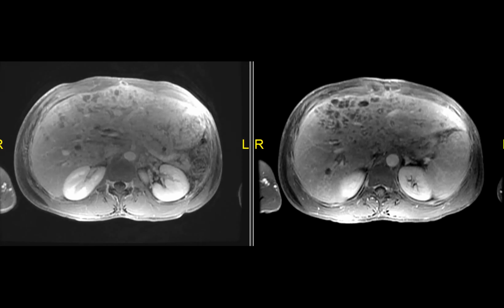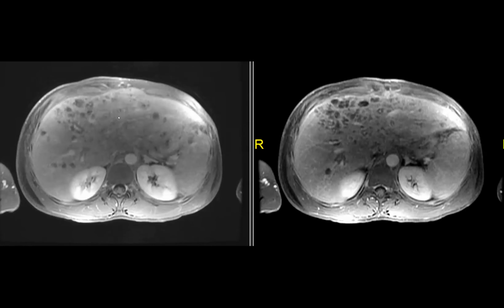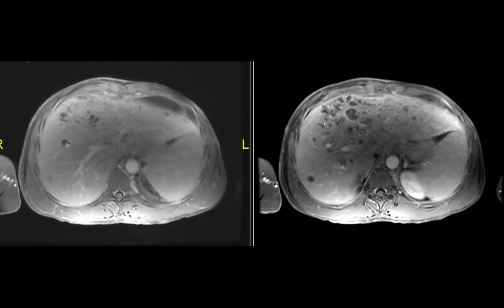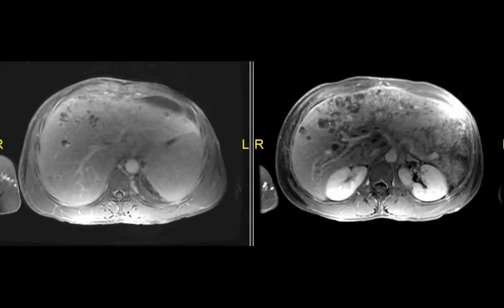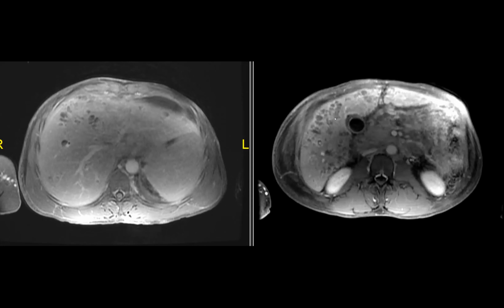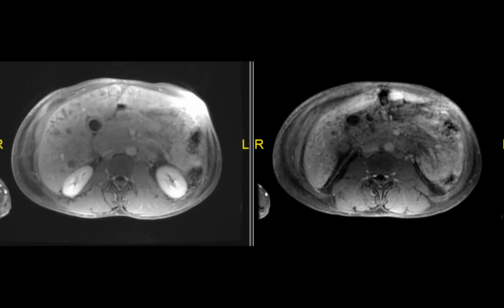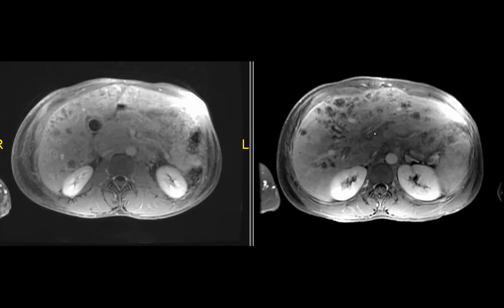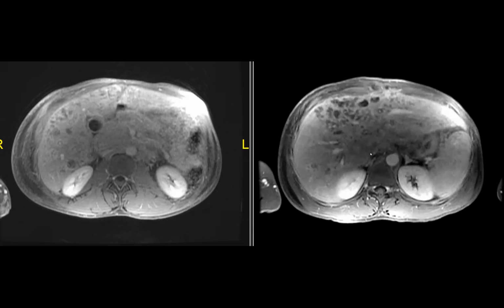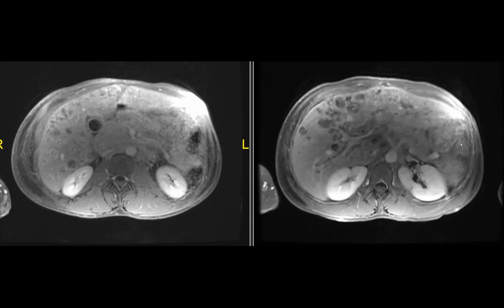Sorry, so how come it's not enhancing? They're not cysts. They're hypo-enhancing, but they're not completely avascular. But so it's perivascular metastasis? Yeah. Some of these are parenchymal, but a lot of them are along the vascular structures you can see here. It's growing along the vessels, and that's a pretty classic location for Kaposi's. It's the same way in the lungs.